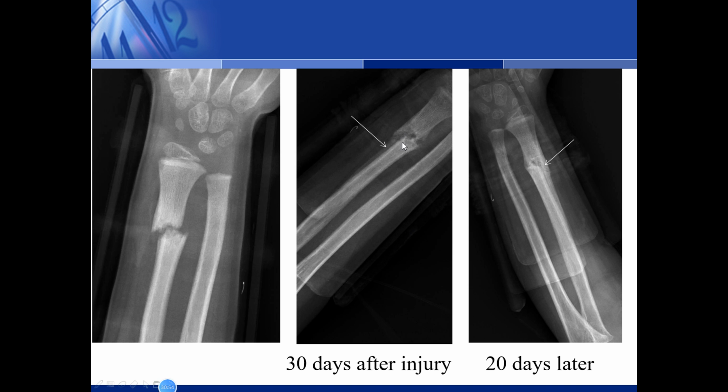In these films, just 30 days after, the fracture line becomes blurred, but the fracture line remains visible.